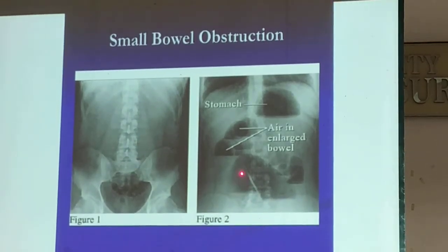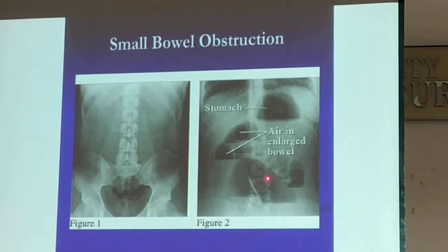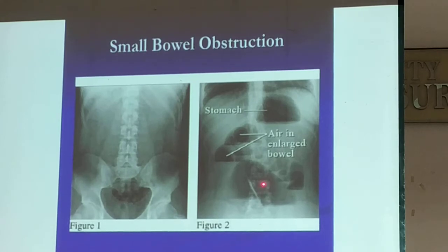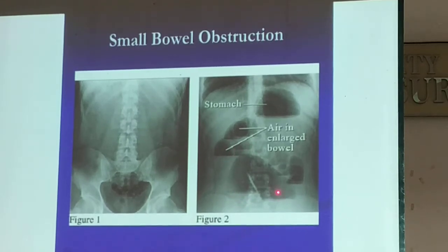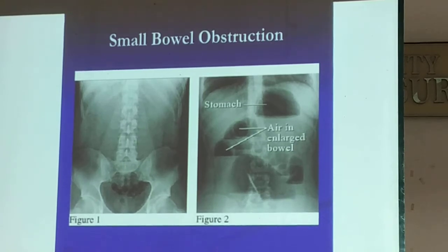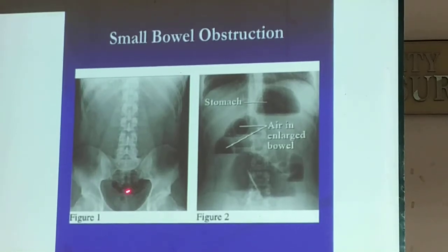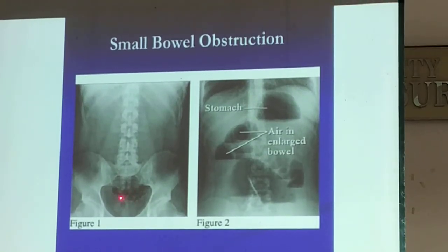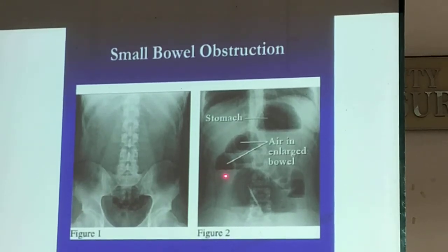So you know that this film is taken upright. Why? Because of the air fluid level. Meron siyang air fluid level. Parang may straight line siya at the bottom. Unlike dito, ito gas ito sa may sacral area. So, wala siyang air fluid level. Okay?